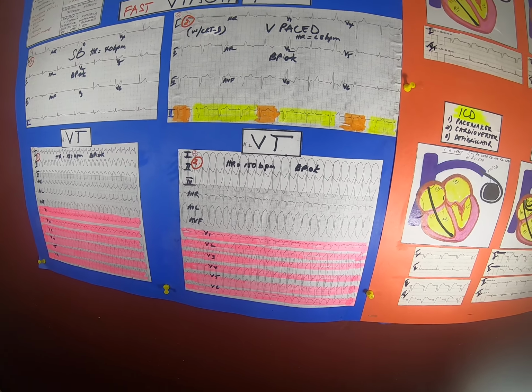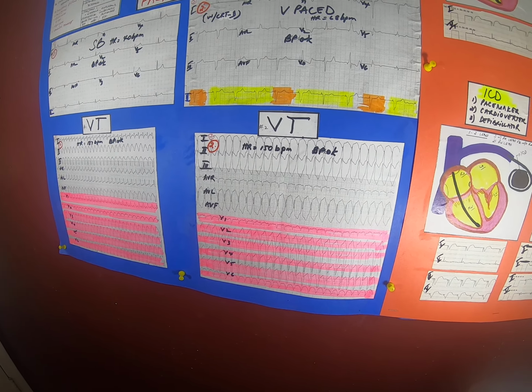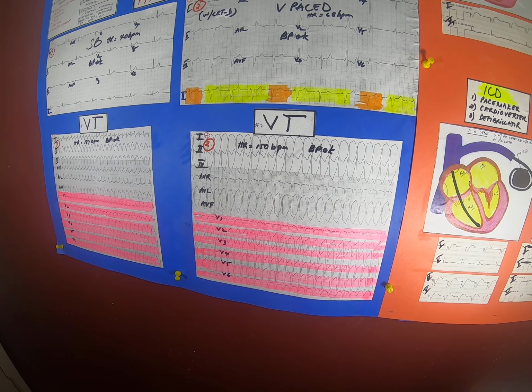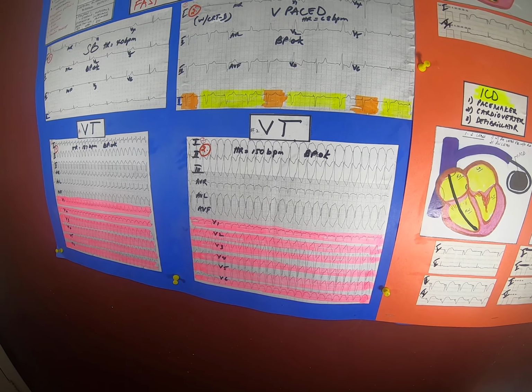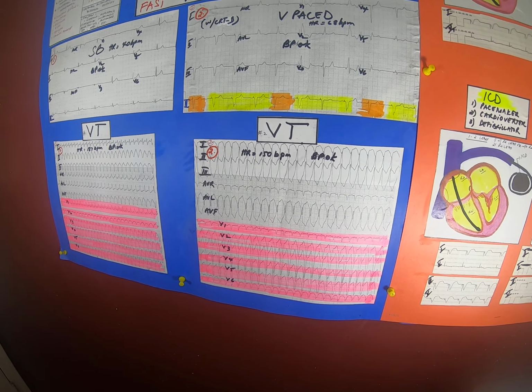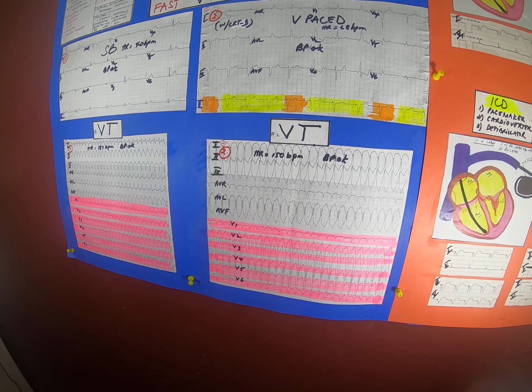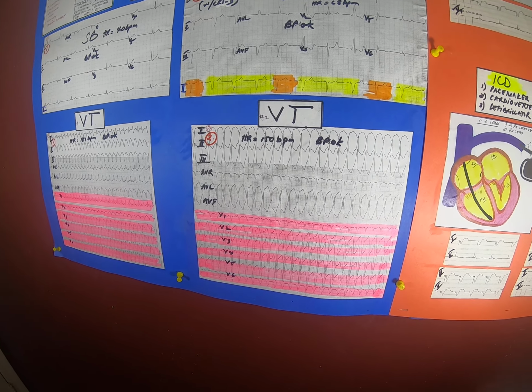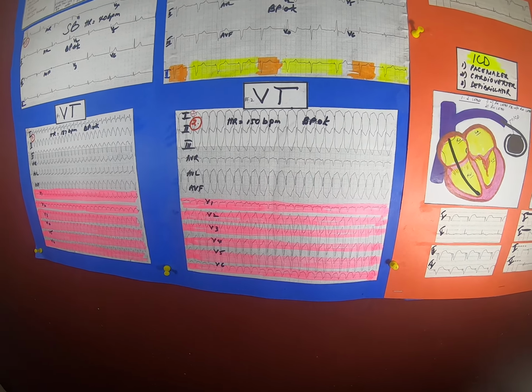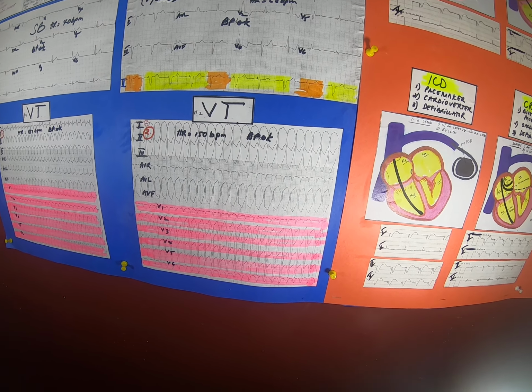We have here a 78-year-old male driven by the wife to the emergency room with complaints of chest pain radiating to the left arm, dizziness, and shortness of breath. There is a history of symptomatic bradycardia, and a permanent pacemaker was inserted, but somehow the ejection fraction deteriorated. So they upgraded this pacemaker to a CRT device for secondary prevention, because if your EF is low, the patient is susceptible to ventricular tachycardia. So they did this upgrade.